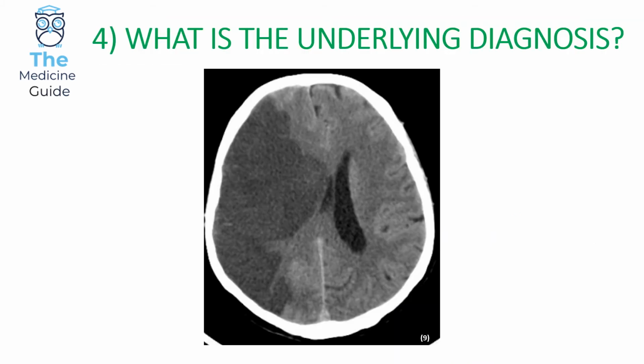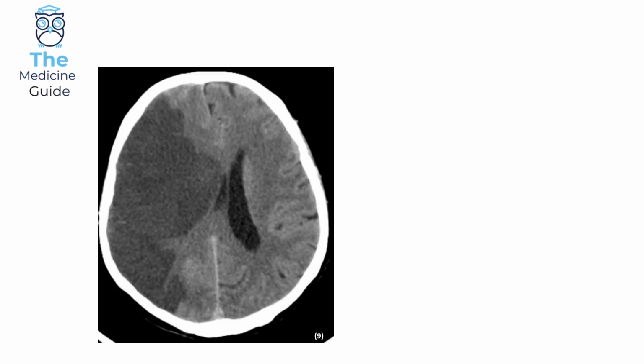So I'll give you about 10 seconds for this one. This one's slightly easier, so you can either pause the screen if you like or wait 10 seconds. Okay, let's find out the answer.